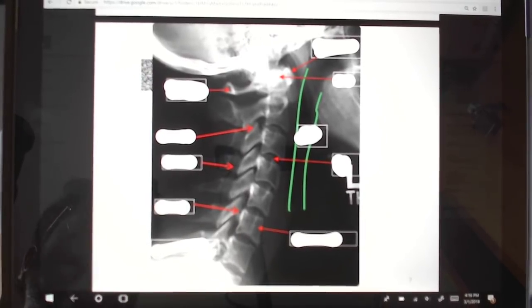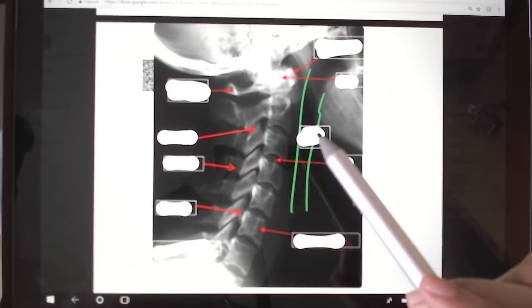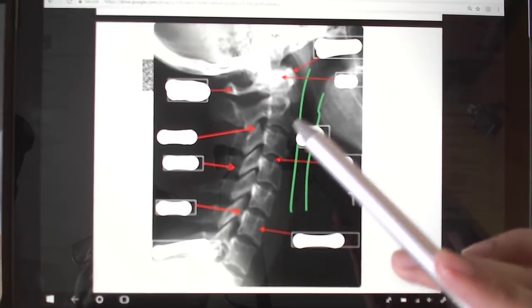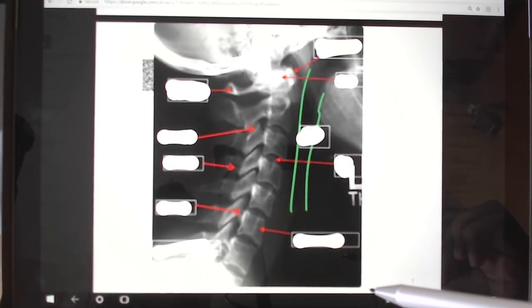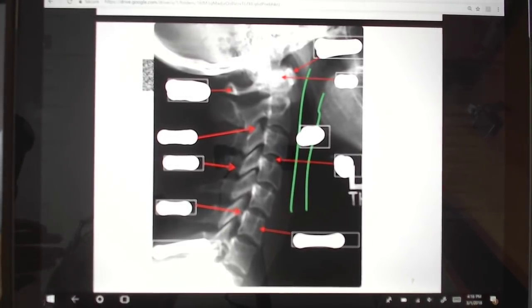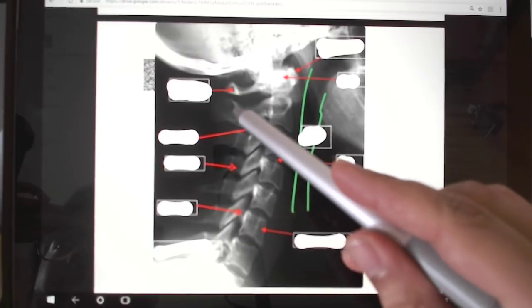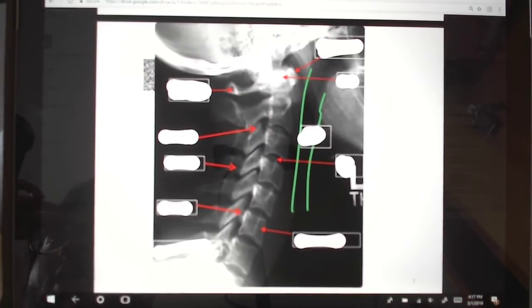Sorry, everything's weirdly located on my desk too, my bad. So this is an X-ray, a lateral view of a spine. Basically with any sort of X-ray, what you're looking for is things like dislocations and fractures. So in a spine X-ray, you might see this part of the spine fractured, or maybe you have an elbow dislocation.